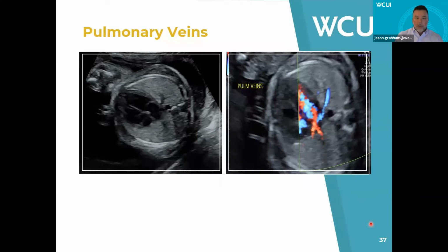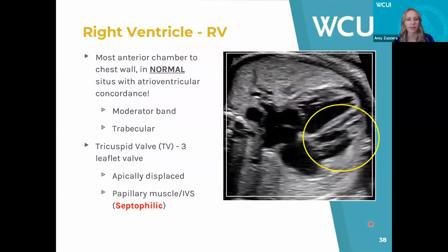Yeah, that's a great point because, we know in fetal physiology, less than 10% of the cardiac output actually comes back via the pulmonary veins. So very little amount of blood and very low velocity. So power angio or power Doppler is a great tool. Okay. Yeah, it can be very helpful.